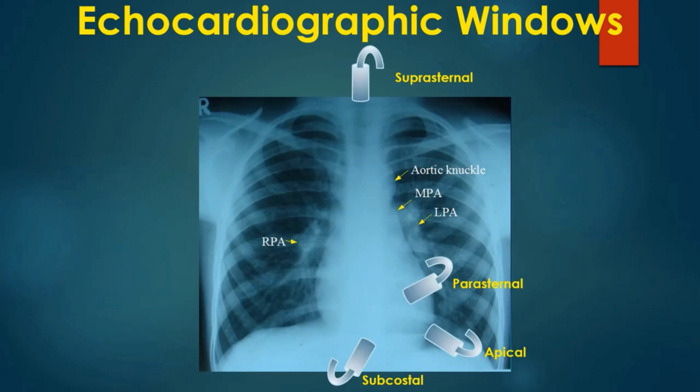Echocardiography is now not restricted to the echocardiographic laboratory. It is used in the emergency department, at the bedside, in the intensive care unit, as well as in the operating room. Hence, a basic knowledge is needed for all physicians and paramedics.